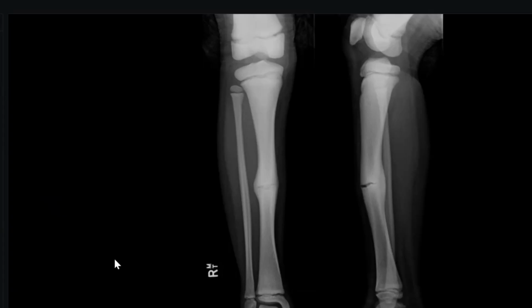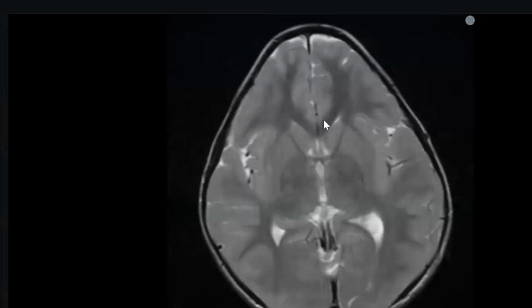The bone density is increased. My differential diagnosis is that it can be pycnodysostosis or osteopetrosis. Excellent. I have kept pycnodysostosis on top because of the acro-osteolysis, which is not a feature of osteopetrosis. Next, I would like to do a skeletal survey with the lateral view of the mandible to see the angle of the mandible because it is quite diagnostic.